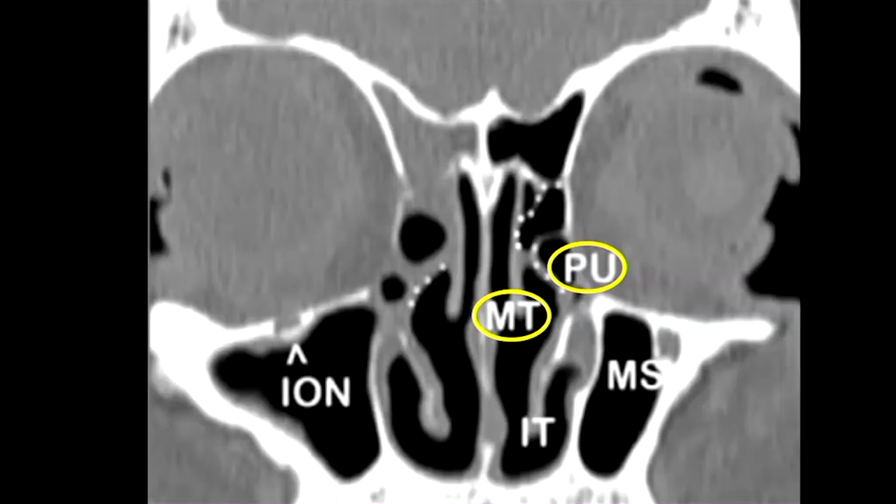So here, the bone is called the cribriform plate. That's the sieve that Narinder mentioned, and that's where nerves will go from the nasal cavity into the brain and the olfactory bulb to tell us what we're smelling.